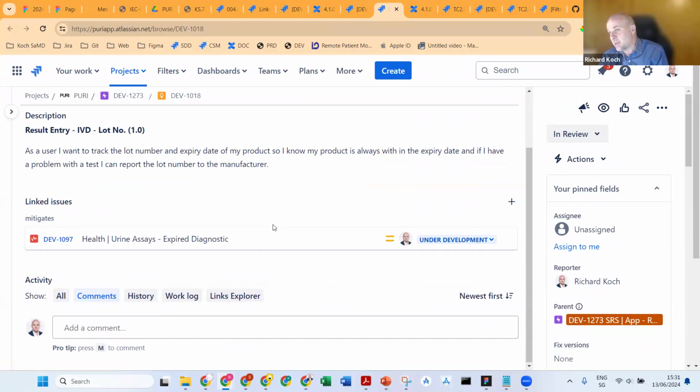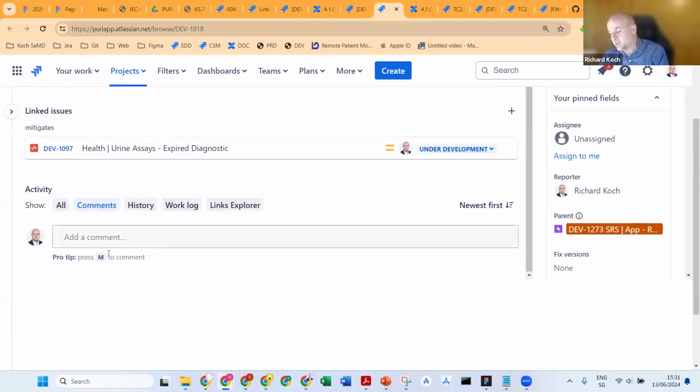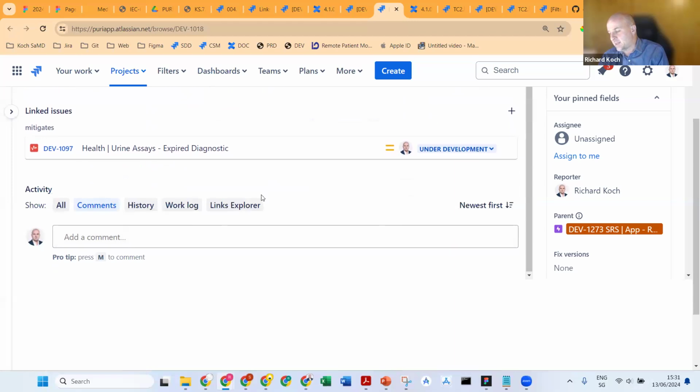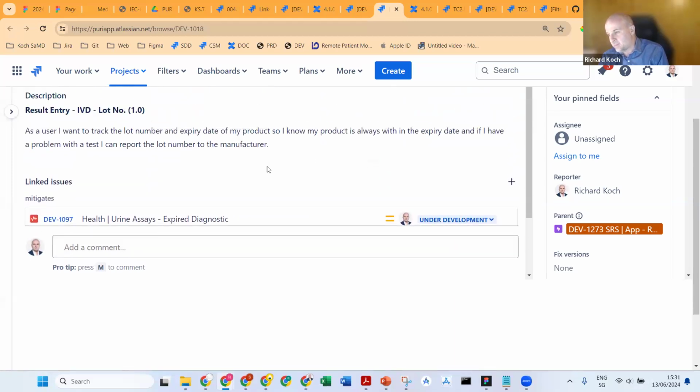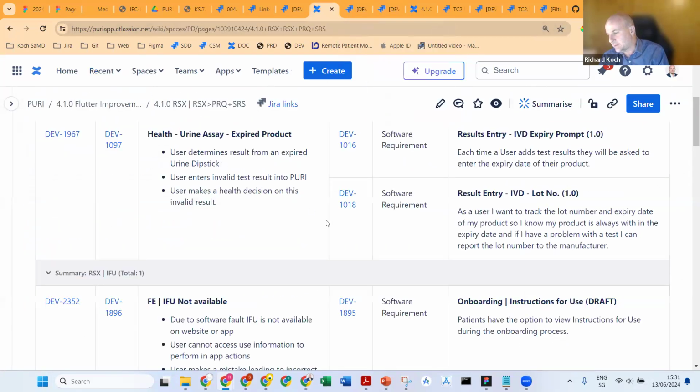I believe anybody, or anybody with the right role, should be able to comment, but only certain people should be able to update core information. So maybe a risk manager will take the comments and then they can make a decision to update it. So again, people can review this anytime. The comments are updated, the risk manager gets a notification, and then they can either accept it, reject it, or put it into the process. So it can be a pretty cool way to do it.